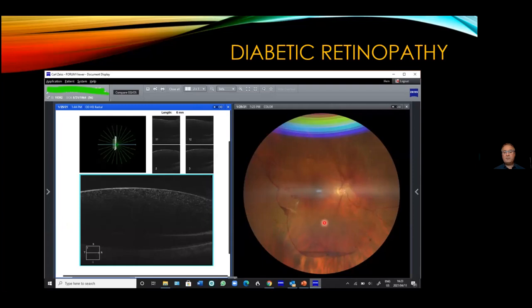So on the fundus photo there's the optic nerve, there's blood that's situated on the nasal side, a little bit of new vascularization of the disc there, new vascularization of the retina. And he got a vitreous detachment, as the vitreous face moved towards the lens, some of these blood vessels ruptured and it actually bled between his retina and the vitreous face.